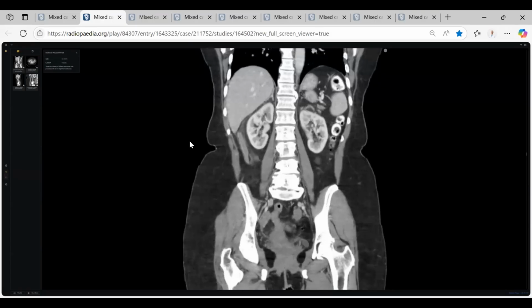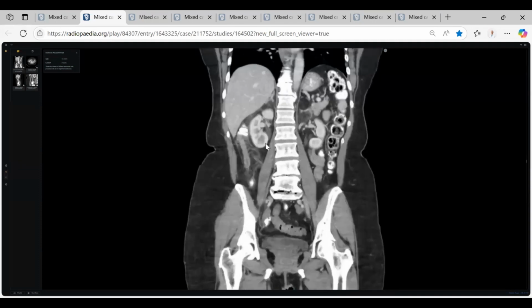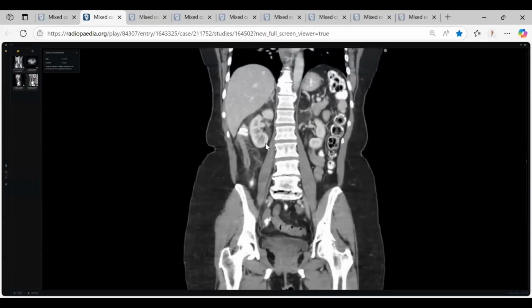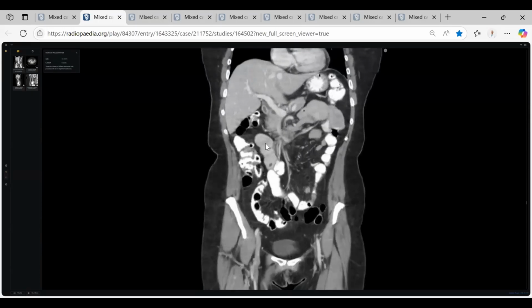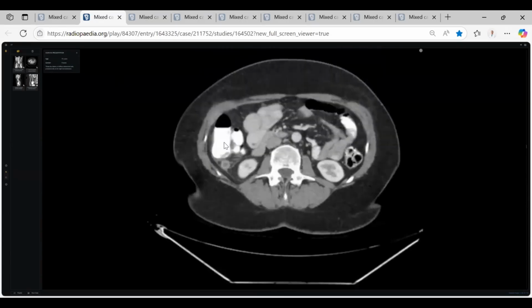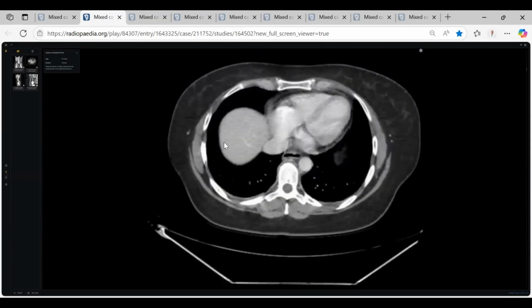Okay. To save time, this is acute subhepatic appendicitis, my colleagues. This is a very common tricky case in the exam. You should rule out any perforation, and you should rule out any mesenteric vascular venous thrombosis. And as usual, you will ask for a lung window to rule out any pneumoperitoneum. Thank you, doctor, so much. You picked it up very easily, and you are brilliant. Next candidate.